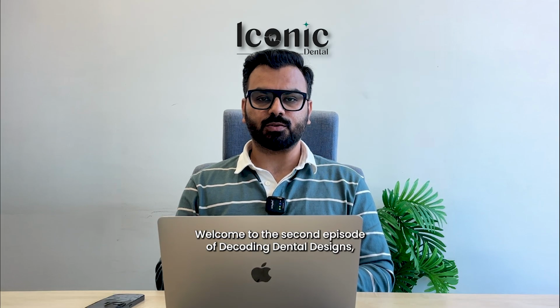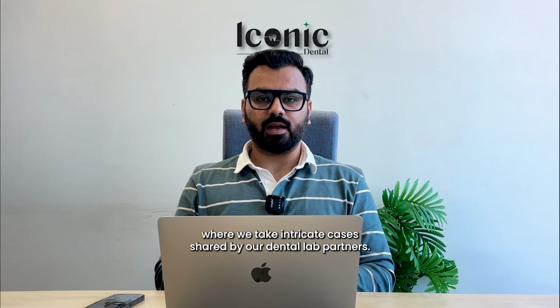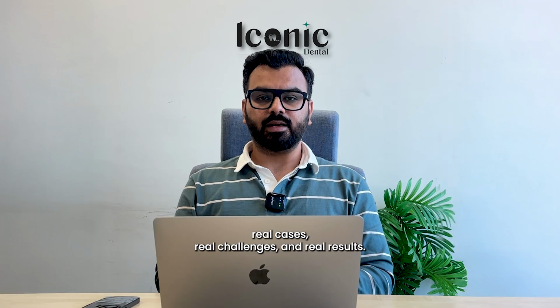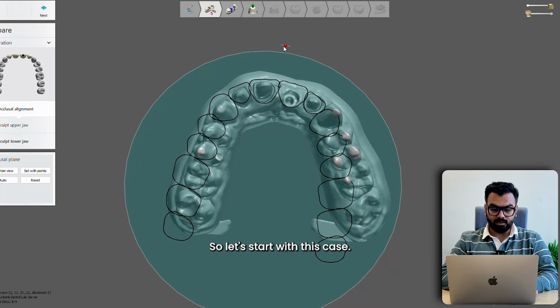Welcome to the second episode of Decoding Dental Designs, where we take intricate cases shared by our dental lab partners. Let's translate the technical process into easy to understand insights, real cases, real challenges, and real results. So let's start with this case.